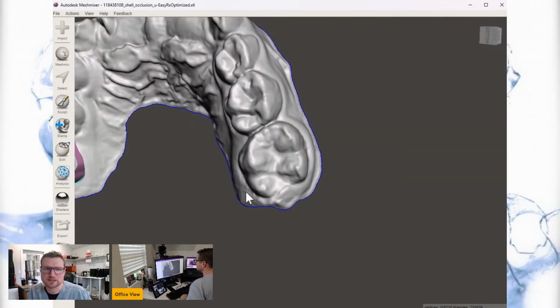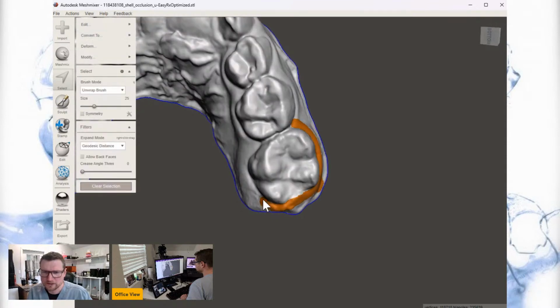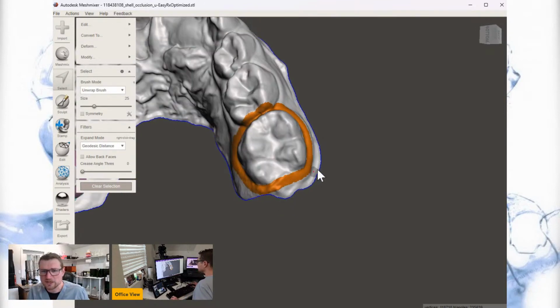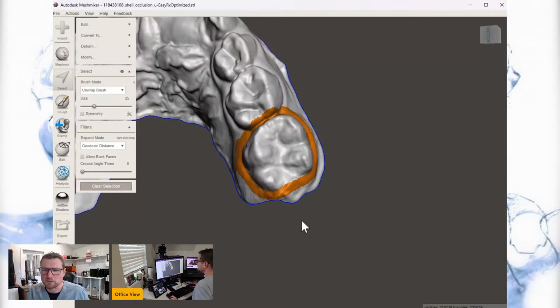Now you can see this can go pretty quick if you're not jabbering away and talking about it. So just highlight just the gums. This is easy to teach someone. Also, I taught my 16-year-old son. He caught on to this real quick, and he doesn't really need to know teeth structure. I just have him count teeth, and he pretty much knows what a molar looks like.